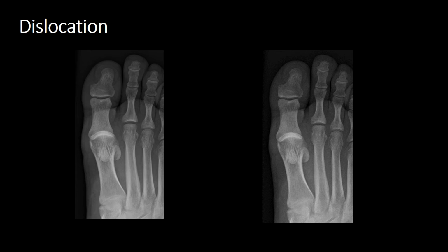We use the search strategy AABCS to ensure that we evaluate the entire image, and C stands for cartilage, otherwise known as joints. Let's look at the second and third metatarsophalangeal joints. We can see that the joint spaces are clearly visible. There's uniformity to the joint space. Similarly, the interphalangeal joint and the proximal interphalangeal joints of the second and third toe are similar in that the joint spaces are visible, they're uniform, and so they're all very normal.